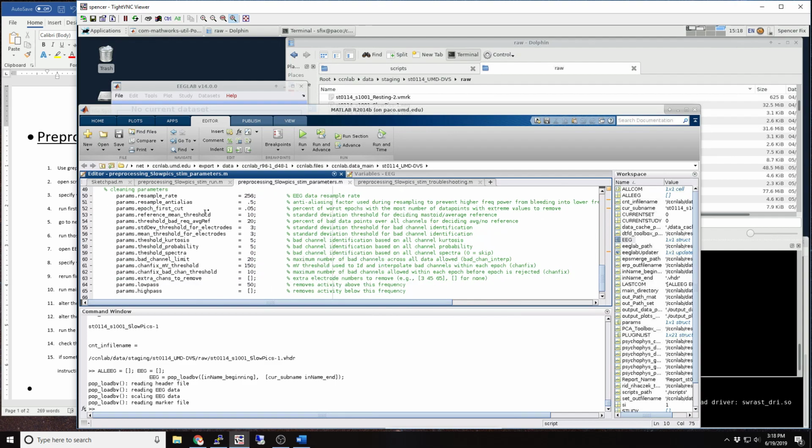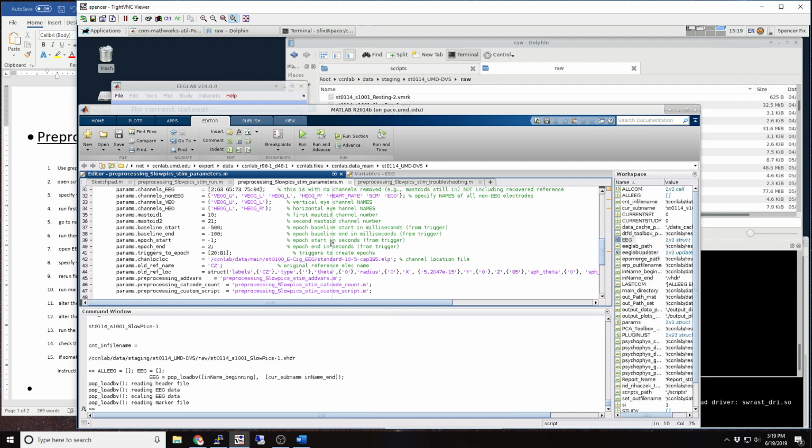And most of these values I've either gotten from published studies or just developed over long term, just trying different values and seeing what works. So I would recommend not messing with any of these for now until you get a better handle on it. I typically don't change any of these things. This is typically the values I use. Okay, so what we want to do is fill out all these values, all these variables. So we're going to go to this EEG structure and figure it out.